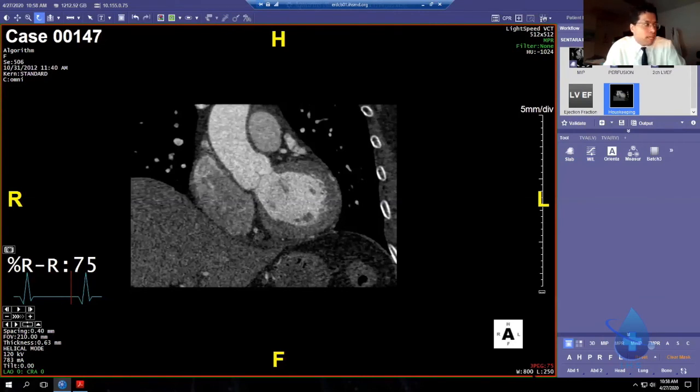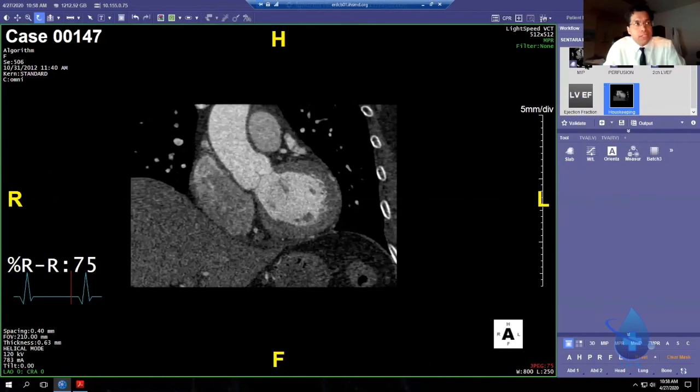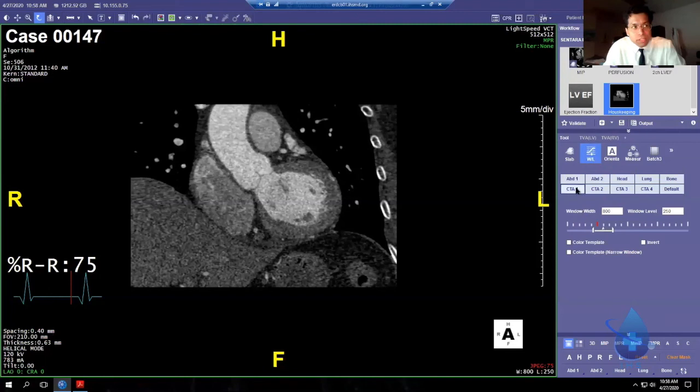They're listed on the algorithm sheet as well, and they're incorporated into these workflow files, which I'm giving you to download, okay? Now, when you log on to these servers, it may not be preset that way when you click on these two presets, but it will be when you click on these two, okay? So that's window width and level setting. Any questions about window width and level before we move on? Okay, you got it, good.